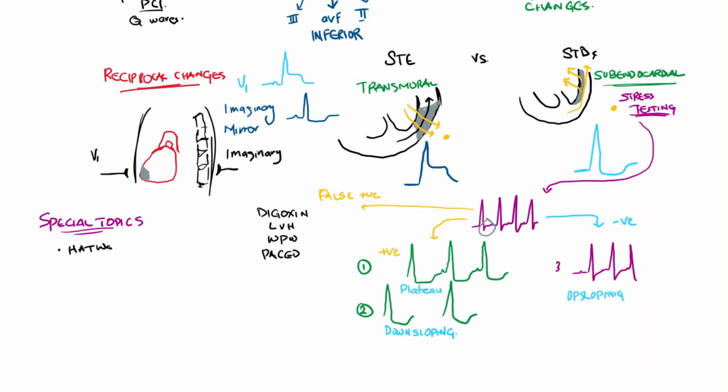The first one of these is a hyperacute T wave, but this is going to be more related to T wave in V1. This concept is known as loss of precordial T wave balance, which basically states that a normal T wave in lead V1 is supposed to be more or less inverted.